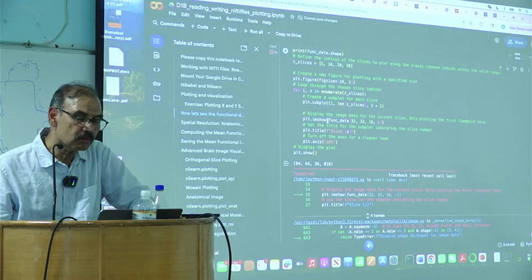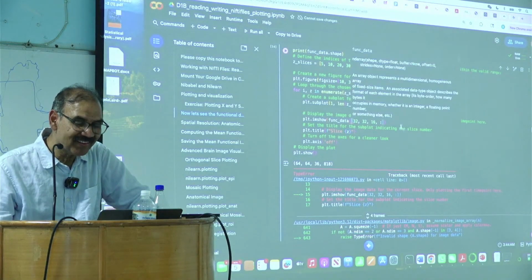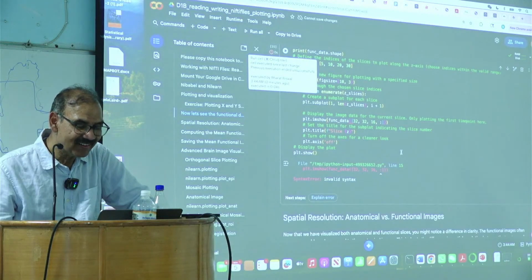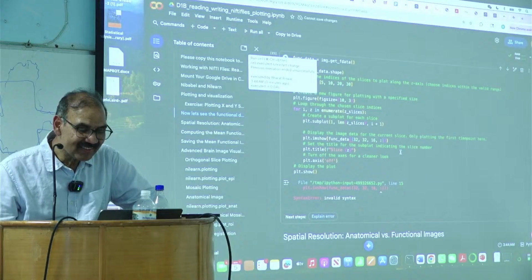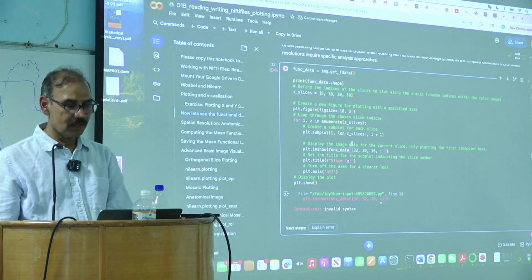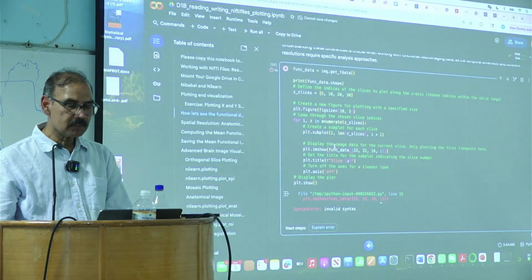Func imshow 32. Do you know where I'm making a mistake? Maybe this.